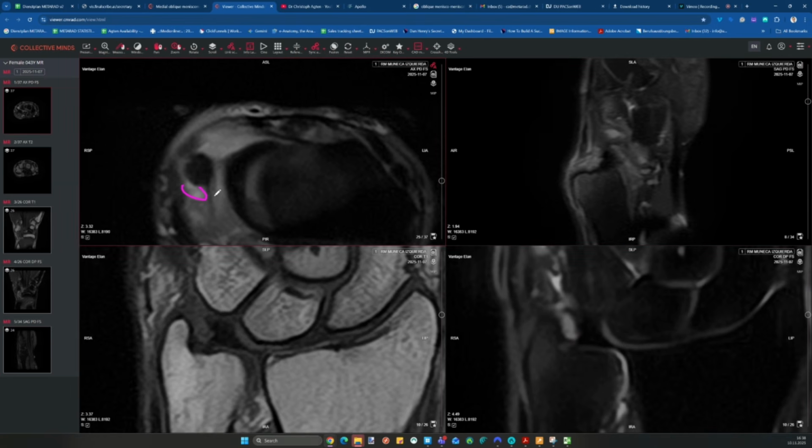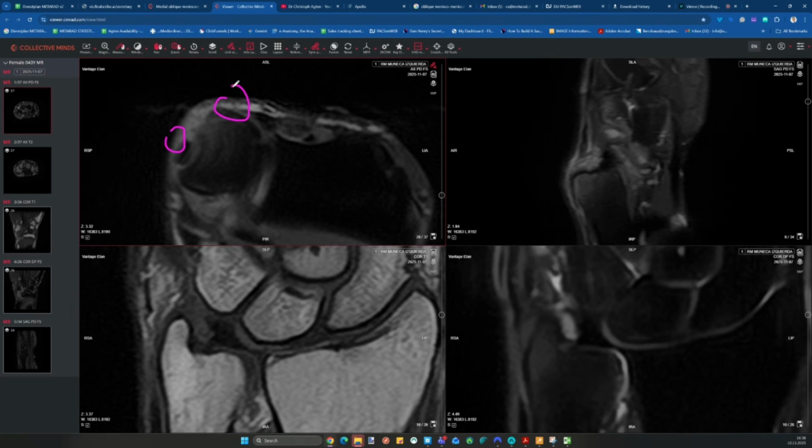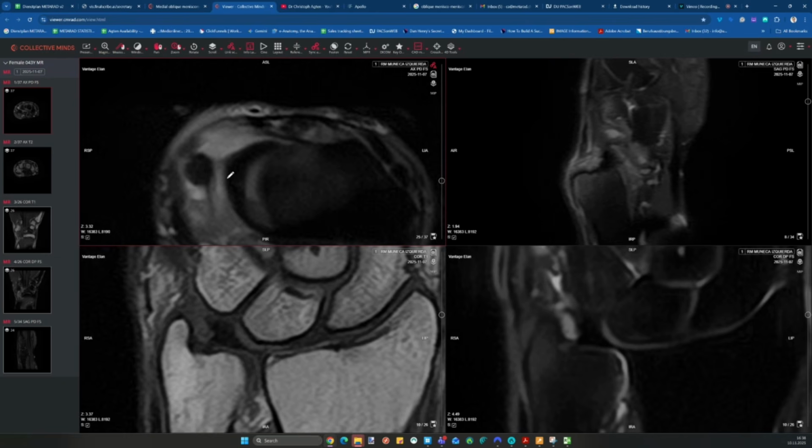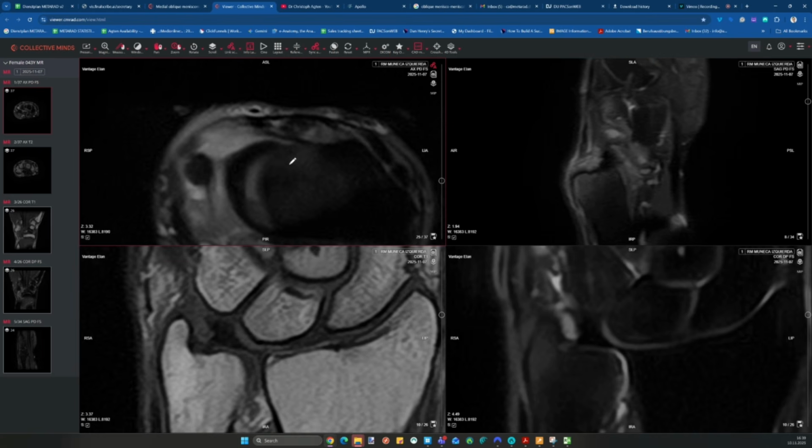Now, when we look at the location of this one, this is quite a pronated position. The ulnar styloid often normally is here, or in supination it's up here. So this is supination, down here is pronation, and this would be neutral. That also twists a little bit the foveal attachments to here, the styloid attachments to here. So there's some variability here.